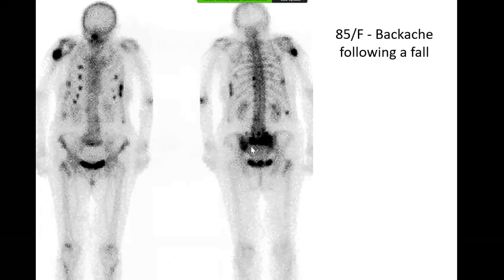This is one of those insufficiency type fractures that can be seen in an elderly patient, or a patient who may have had localized radiotherapy to the pelvis, and they have weaker bone, and then they get this H type of fracture. You don't always get this H shape.